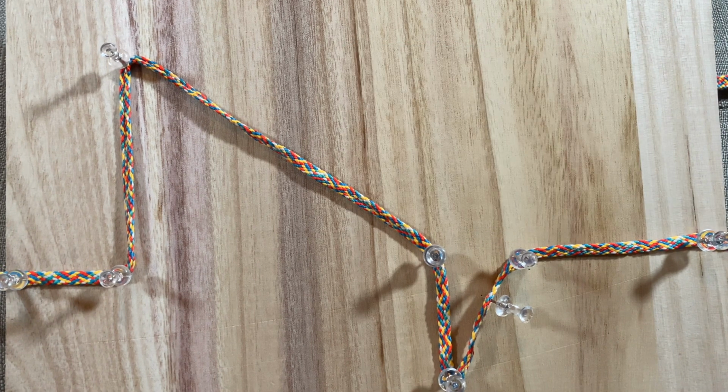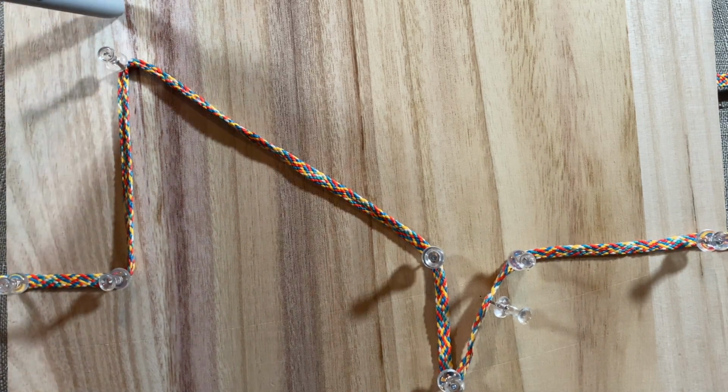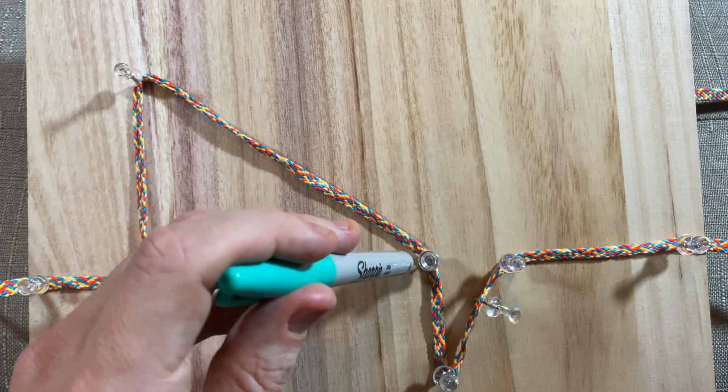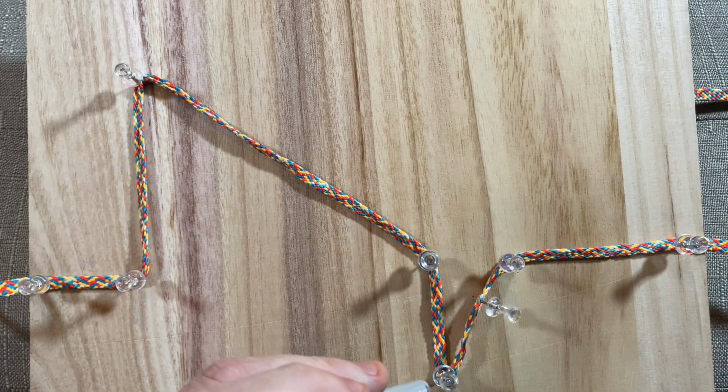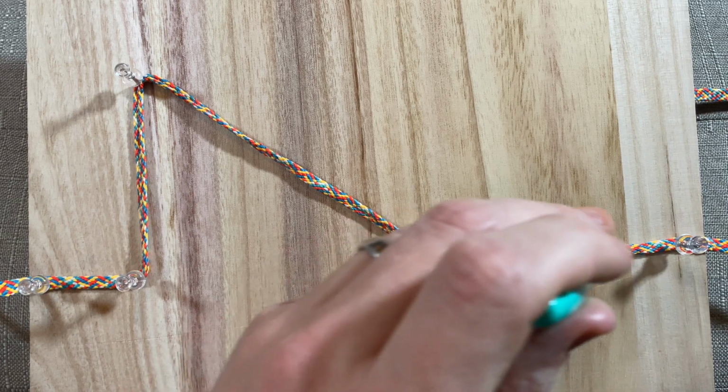First, let's quickly review what a normal flow waveform looks like in volume control ventilation with a decelerating ramp. So the baseline is here, beginning of inspiration is here, then deceleration throughout the rest of inspiration. Exhalation starts here, and when exhalation is passive, it looks like this waveform here, so it exponentially returns to baseline.